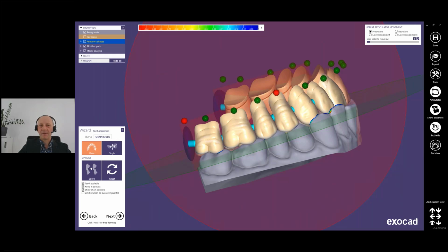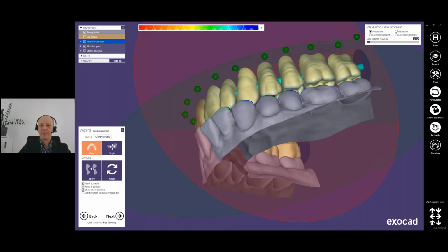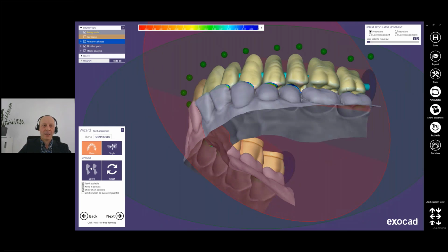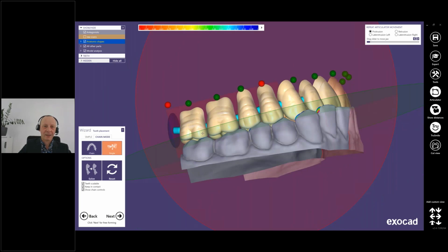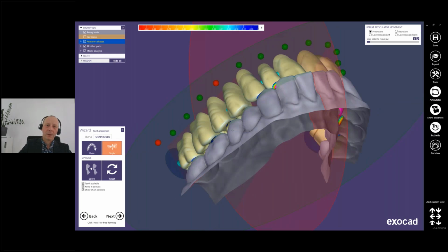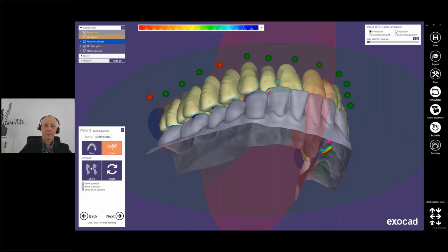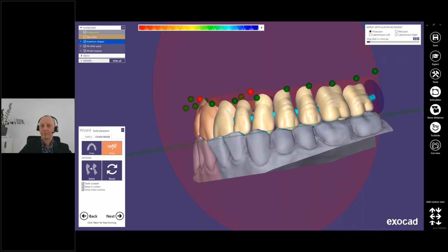Then I will fix them and set the second side of my posteriors. Then I go from chain mode to single mode and adjust the individual positions of my posteriors. Okay, it actually takes some time, but I can adapt it later on, not an issue.